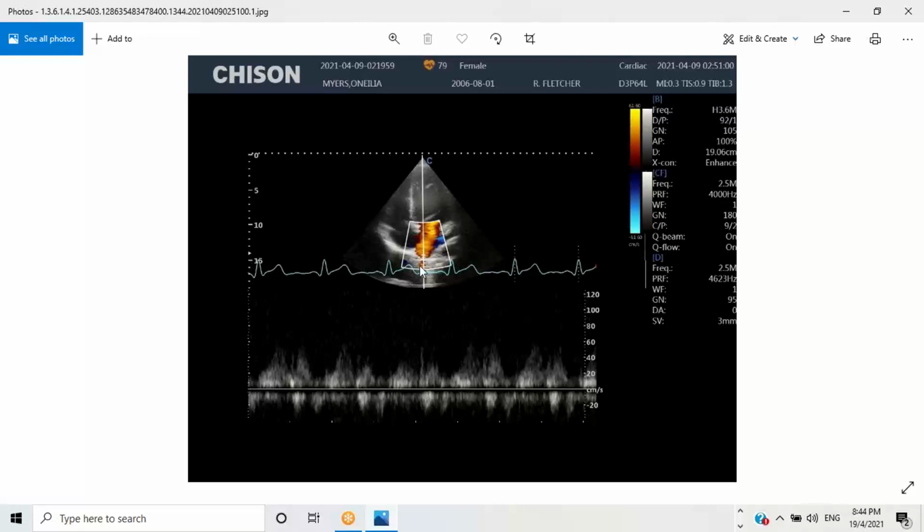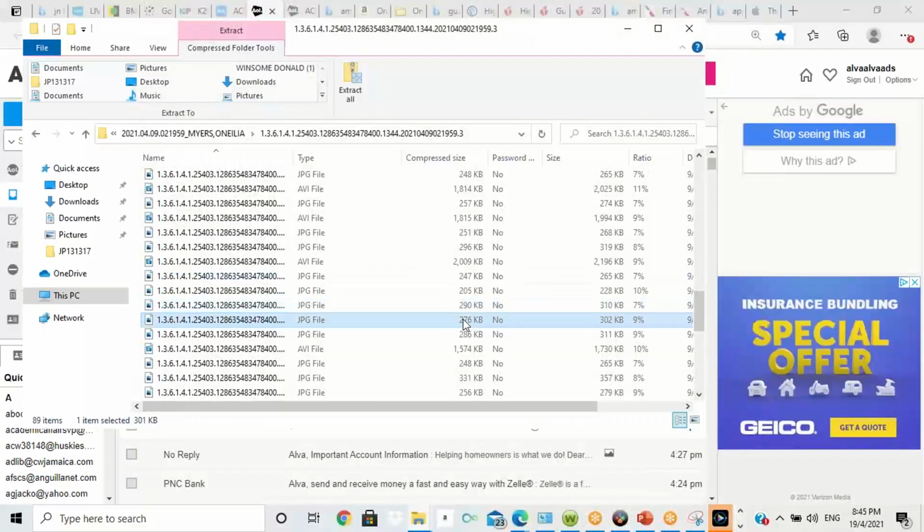In ventricular systole, you're going to have flow from the pulmonary vein into the left atrium. In ventricular diastole, you're also going to have flow from the pulmonary vein into the left atrium. But when the left atrium contracts, it's going to force blood backwards into the pulmonary vein. So it's moving away from the transducer. Hence, your atrial flow reversal is below the baseline. So systolic component, diastolic component, atrial flow reversal. You should be able to explain what's going on.